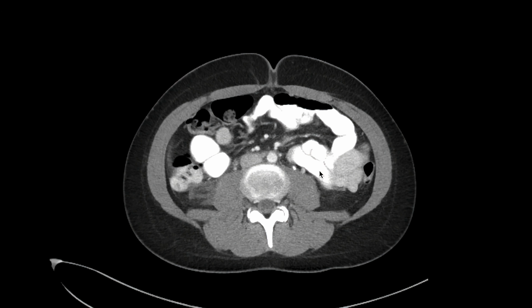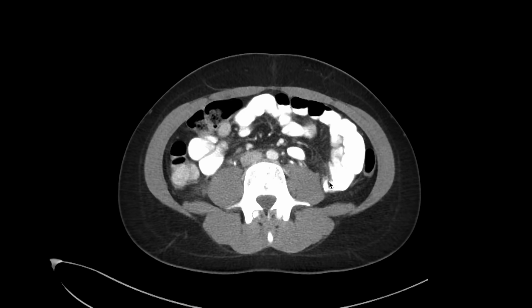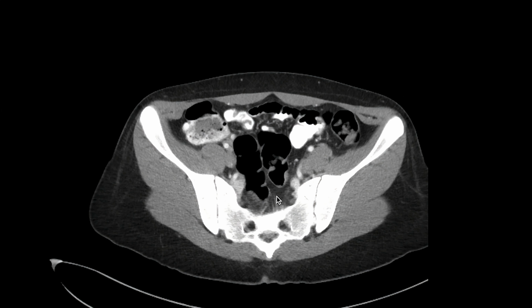Things like rounded lymph nodes, heterogeneous or cystic change, those things can strongly suggest that the lymph nodes are abnormal, even if they're much smaller than a centimeter. And the clinical context is also very important as well. If the patient, again, has a rectal cancer, for example, and has a 7 millimeter rounded node along the superior rectal chain, that is very suspicious for being involved with cancer.